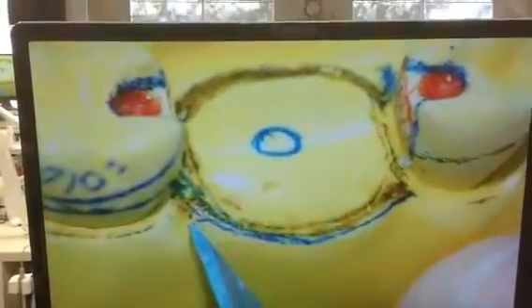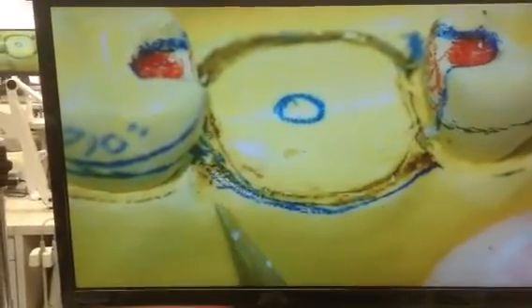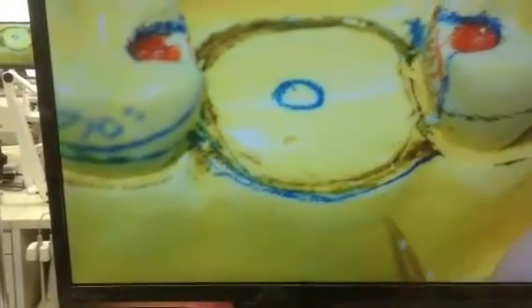It's glued into place. So when Dr. Smith has you mark it in brown, he's having you mark where the tooth is going to sit. Therefore, the brown and the blue are really the same line out here. It is acceptable to have the brown inside the blue, in which case that would indicate that there's going to be a little band of metal out here with the tooth above it.